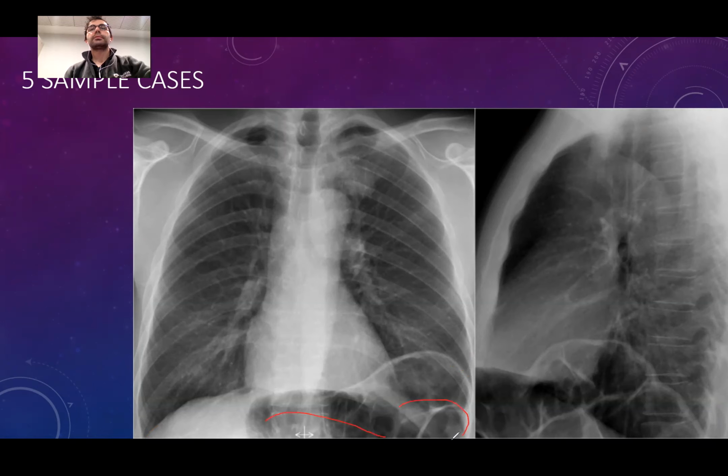We are seeing some bowels through that. Can you name them, doctor? Mustafa hocam, can you name them, Mustafa? I was saying name them, not yourself. What are these? These are large bowels, right? Look, there are haustra. They are not villi. They are big haustra. So these are large bowels. So this patient definitely has some retention in the bowels. What else?